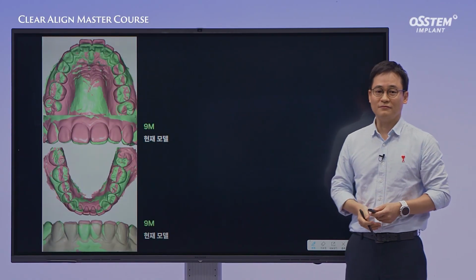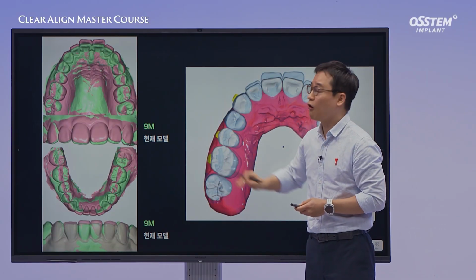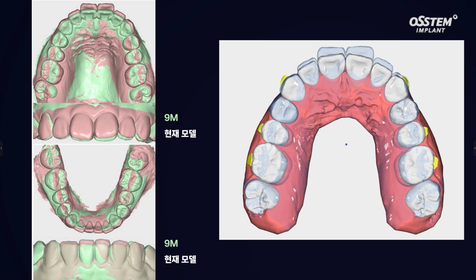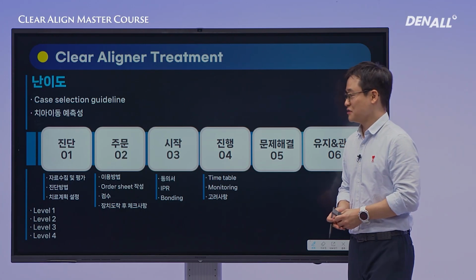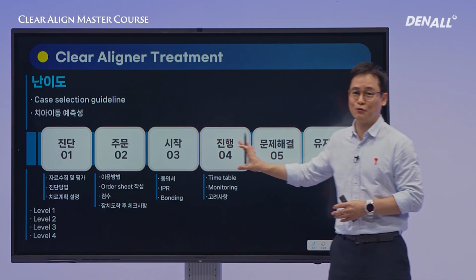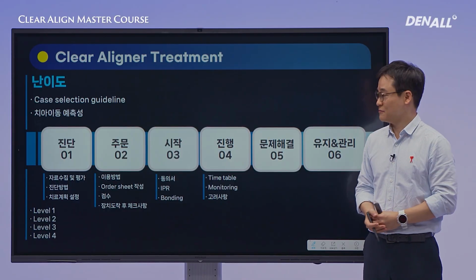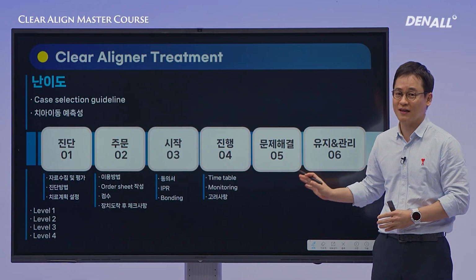In the final results, the outcome was largely consistent with the initial treatment plan. Of course, not every case proceeds as planned, but like this case, favorable outcomes are also possible. The insights gained here can serve as a reference when facing similar cases in the future. Although categorized as a simple case, it required careful consideration and a structured process. Clinicians are encouraged to follow such protocols in practice, which can lead to successful results.